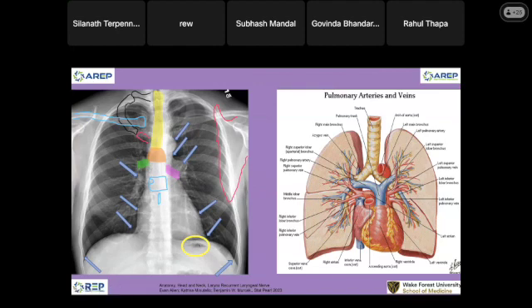So let me show you. A pleural effusion on a very lateral view, a right subpulmonary effusion. It is linear and confined to the diaphragm. Nice anatomy. You will be able to tell me if I show you, that's what we call a subpulmonary effusion. So the space here, not the air space, the thickness of this structure between air and diaphragm should be less than 1 centimeter.